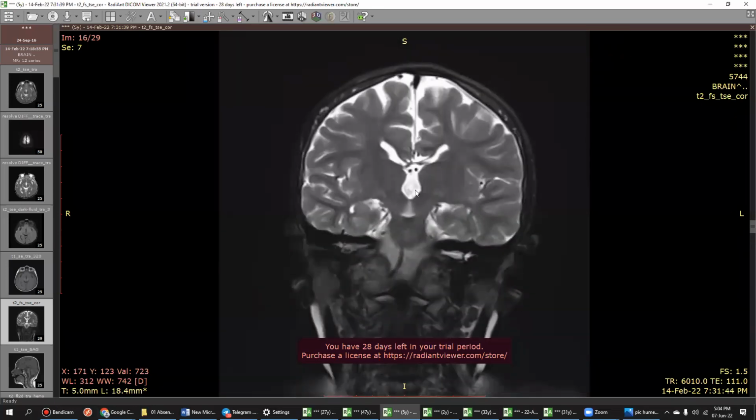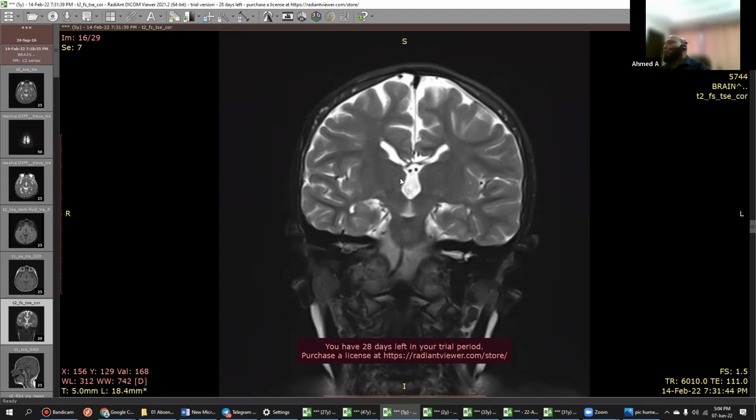Coronal is a very classic Viking horn, because anywhere you see normal brain MRs on the coronal, they never will be oblique, slanted. They'll be more horizontal. Here they are coming towards each other, towards the midline.